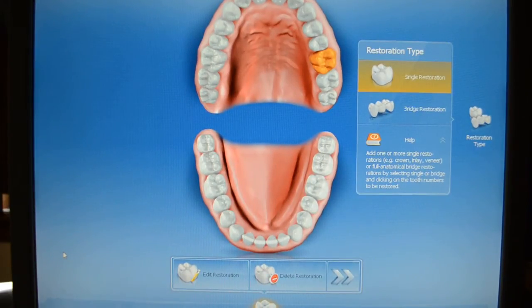Welcome back to the technology track. Today's module is going to focus on building a tooth. We're going to build tooth number 14 today. Building a tooth in biogeneric copy.